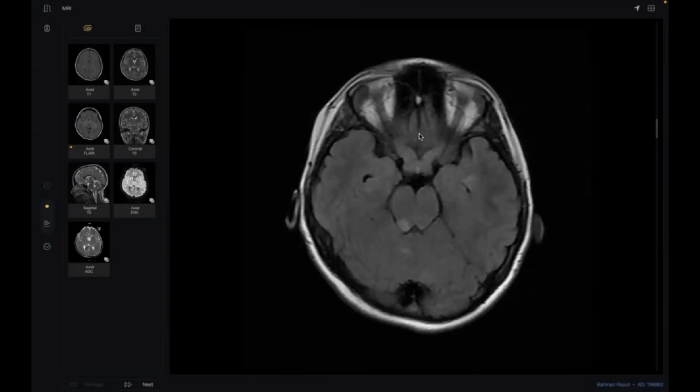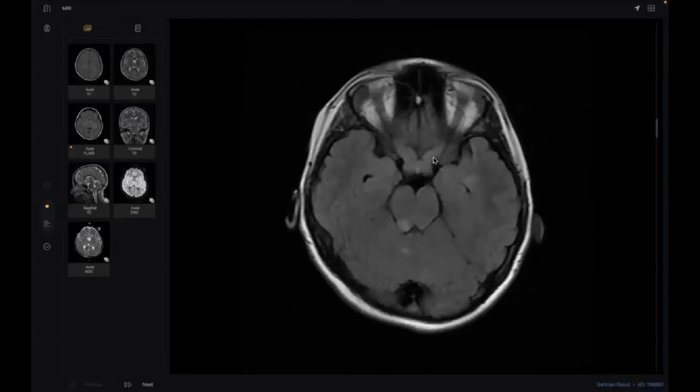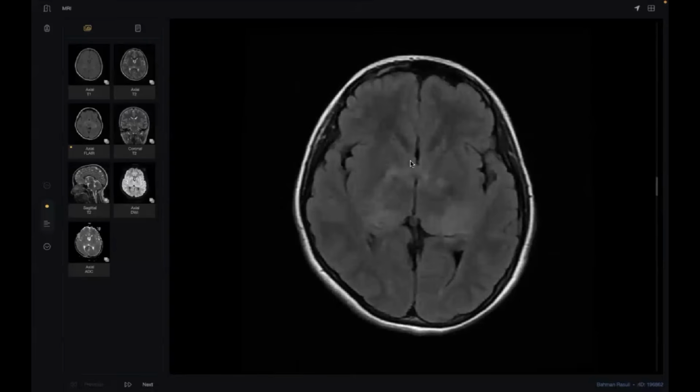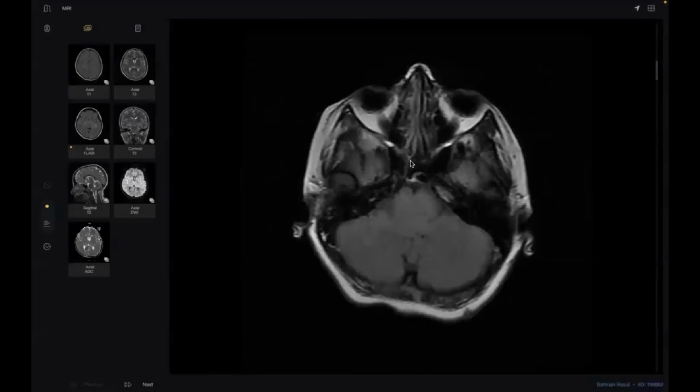If you didn't find anything, for example, if this case didn't have this bilateral optic glioma, it is acceptable to put any metabolic disorder or encephalitis within the differential diagnosis.